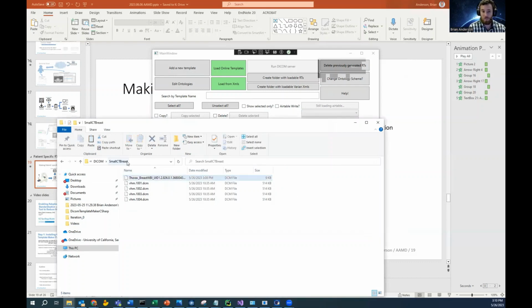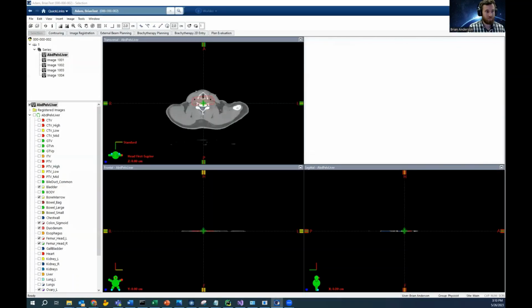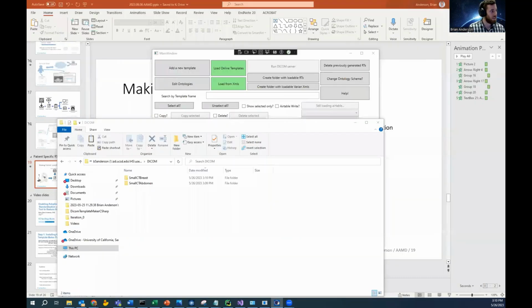All right, so now we have these, and if you set up the DICOM server and have your therapist trained for what site's being treated, they can just add the series description. And then whenever you go to import the patients, or whoever imports them in your workflow, then you can just come over to import, and I'm going to have to pull this over to the other screen because there's PHI. So I'll say import DICOM.